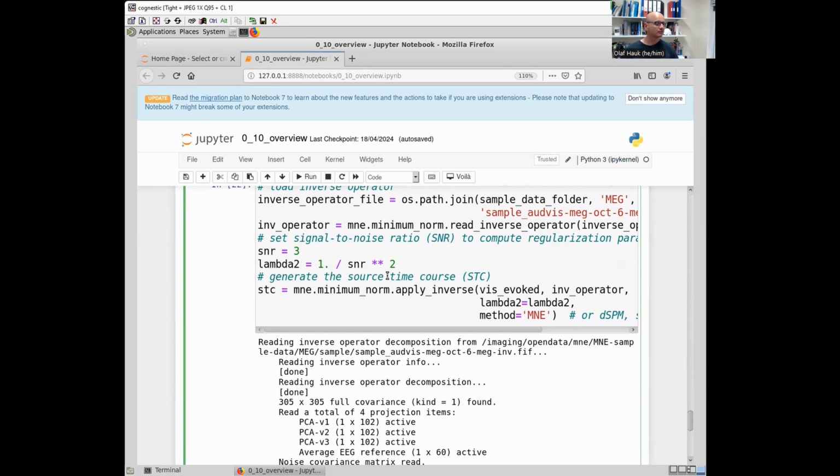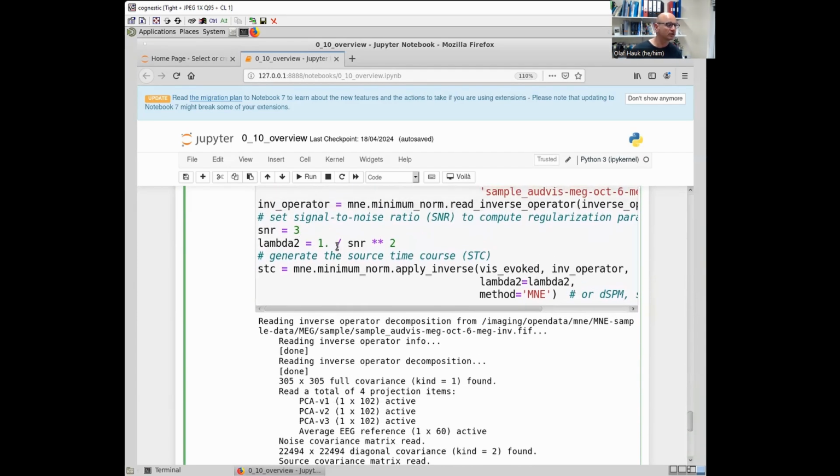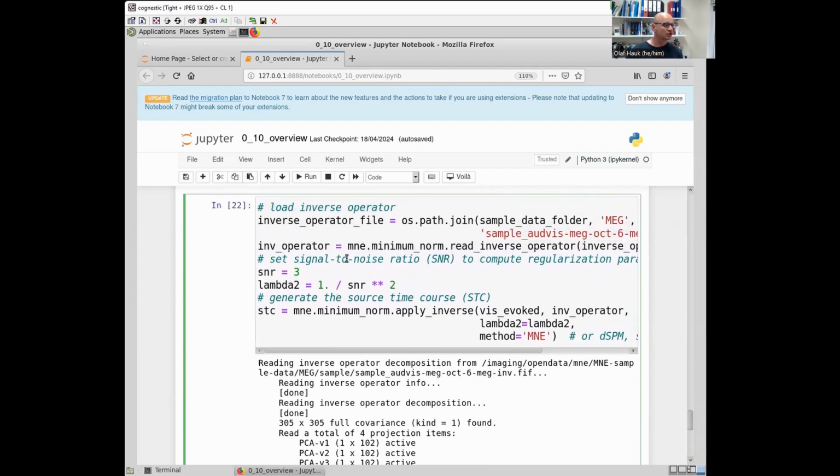There is no really precise answer for the choice of this parameter, because the signal to noise ratio will change from the baseline across the time course of your data. So you can just find a compromise or something that's approximately right. And in later sessions, we will see that your analysis is usually quite robust with respect to this parameter. So, with this, you are in business.